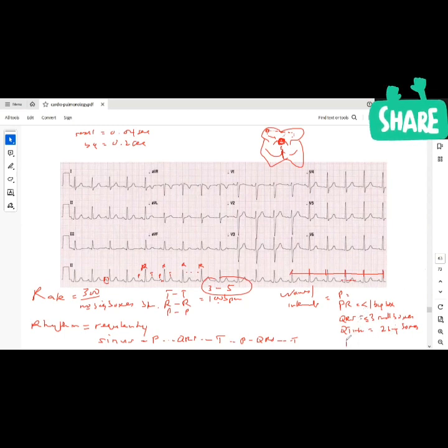And then you look at your T wave. You can see the T wave height is about half of the QRS complex, right? Imagine if the T wave is taller. That's a peaked T wave. Sometimes the T wave can be flat or inverted, or you won't see it at all, right? Like we saw for ischemia, an inverted T wave. If it's too tall, a hyperacute T wave will be hyperkalemia, it could also be ischemia, right? If it's absent or flat, it may be hypokalemia, right? Things like that. So basically, you want to identify your waves quickly. Let's say I go through all these steps quickly and they all look normal. It's going to be a normal ECG, right? I'm done.